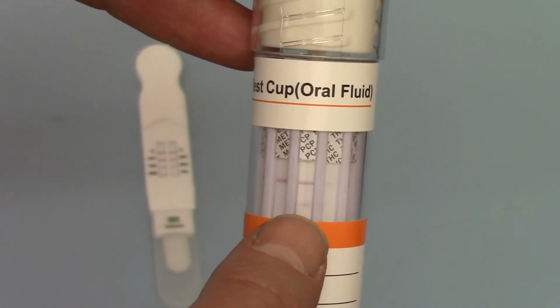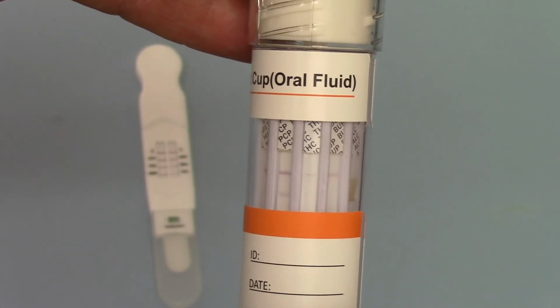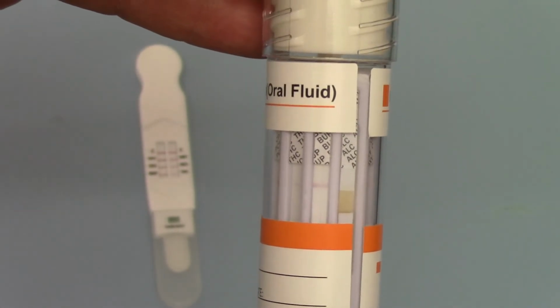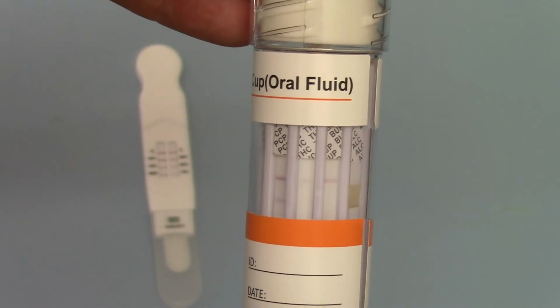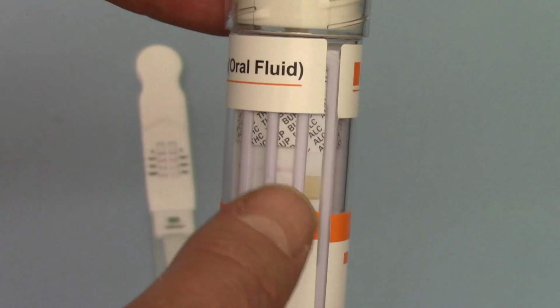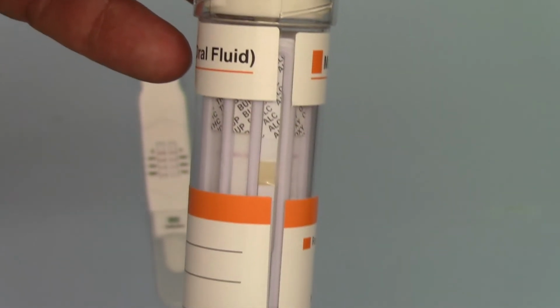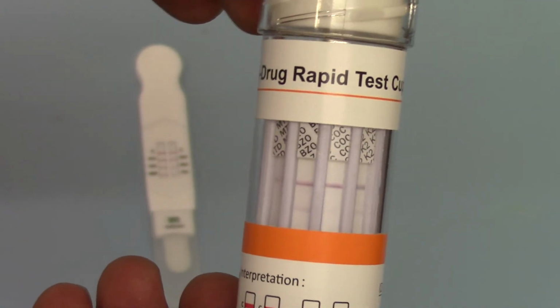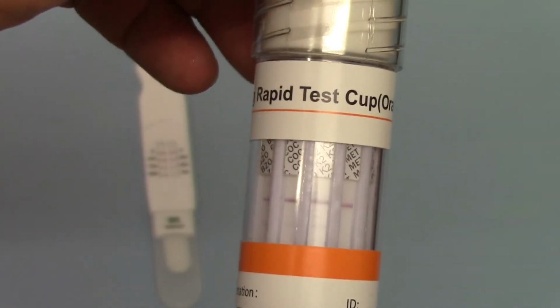And again, PCP, negative, positive for THC. Presence of a very thin control line, but that is a clear positive result. And again for buprenorphine, control line, much darker than the THC control line you'll see, but you will get these variances. They're absolutely normal. No test line, so that's a positive, and on this particular test you've also got the alcohol test there.